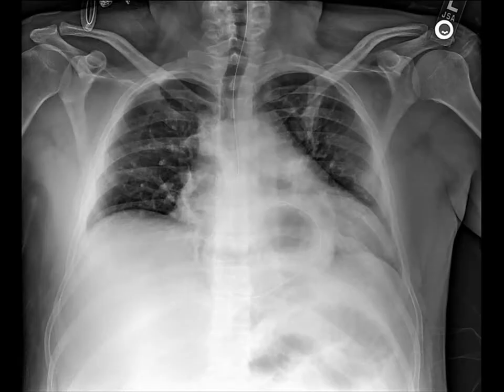This is a 17-year-old gentleman who had an NG tube placed. You can see it here overlying the esophagus and the trachea. We're reassured that it goes beyond the airway and appears to be in the stomach bubble, and then we see it continue up back above the diaphragm. So this was actually found to be in the patient's hiatal hernia.